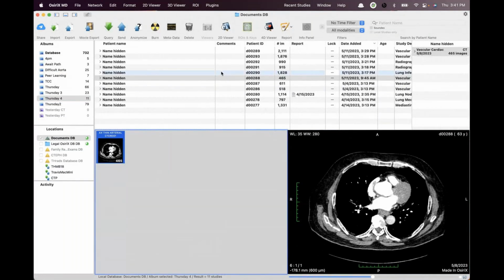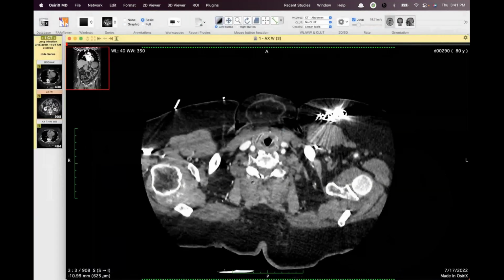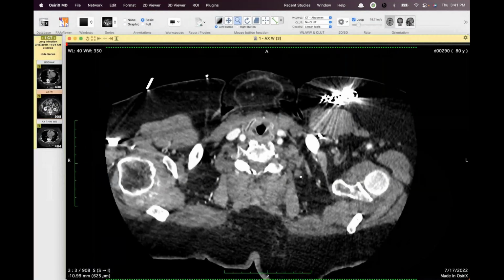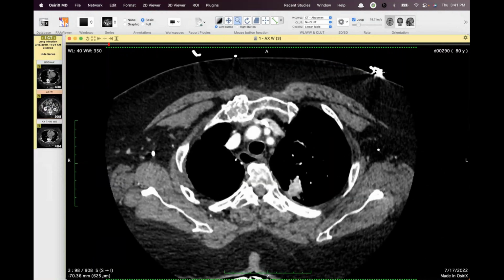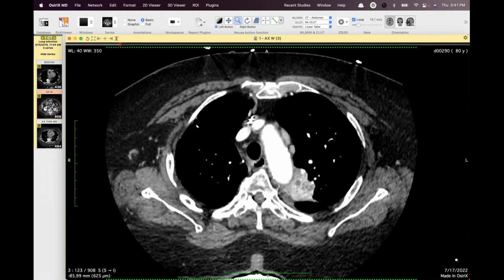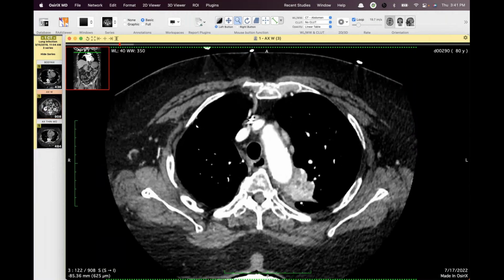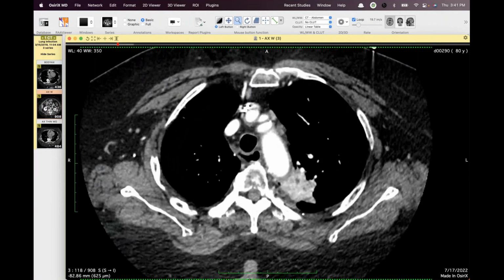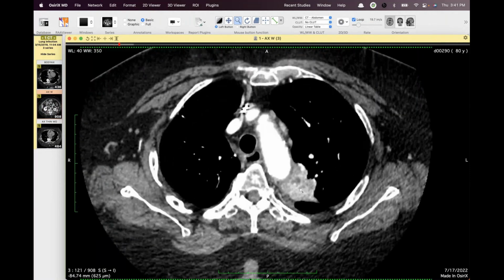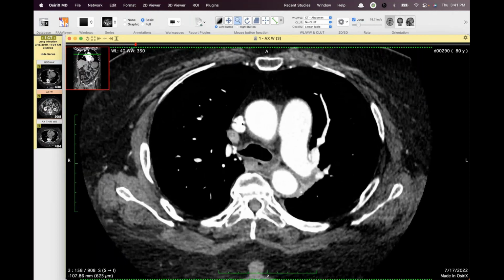This is a case I've never seen before, and I'm curious if anyone else has, because I think we may have to write this one up. This is a patient that for whatever reason got this CT last summer, and as you can see, they have what I would call an area of consolidation or mass-like consolidation, and you see some dilated airways in it, and some mucus-impacted airways. There's no obstructing endobronchial lesion centrally.